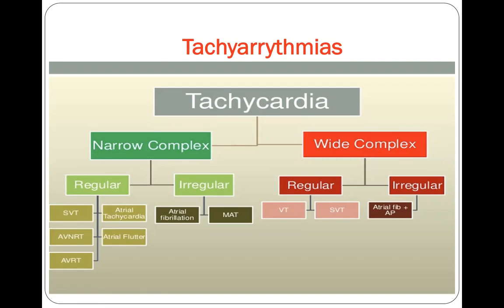In this video, we'll discuss the differential diagnosis of tachyarrhythmias. As we said in the chapter on heart rate, tachycardia means a heart rate above 100 beats per minute. Let's first see this demonstration.